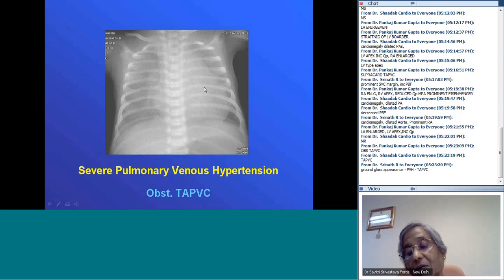Kids, I have got a couple of very good X-rays. Give some answers.